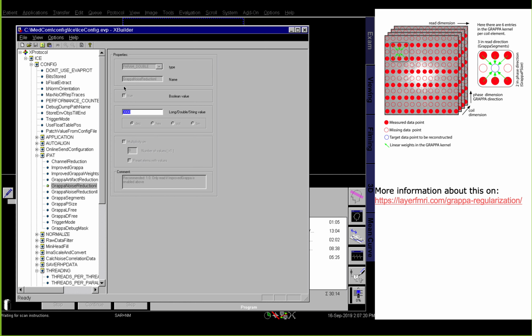And at high resolution layer-dependent fMRI, we usually have array coils, meaning usually we have a 32-channel Nova coil, for example, where we can easily go to larger regularization strengths. This means that neighboring k-space points will become less independent. And as long as you have small coils that are much smaller than your field of view, that's absolutely okay to do so. On the Terra, if you want to change this parameter, that's a bit different.